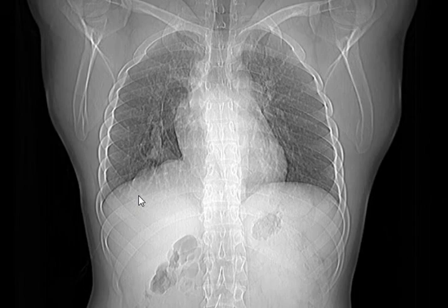Showing bilateral hilar shadow. طبعا of course because this is a CT scout, the patient is not erect, he's supine. Okay, so يعني you have to treat it as a supine X-ray, يعني elevated diaphragm normal, شوية widened heart normal. زين. Lung fields are clear. In the right lower lobe, you can see like a vessel. Excellent. Beautiful. Love it. Continue.